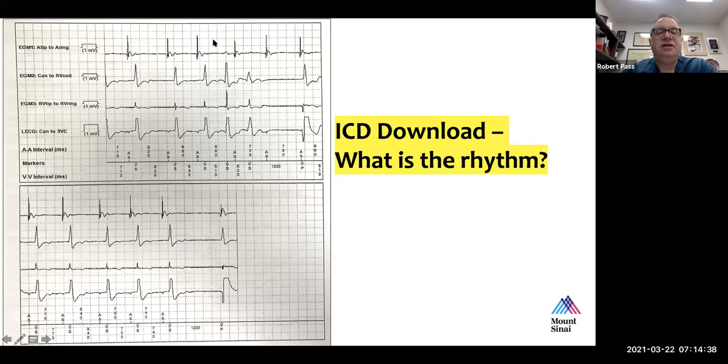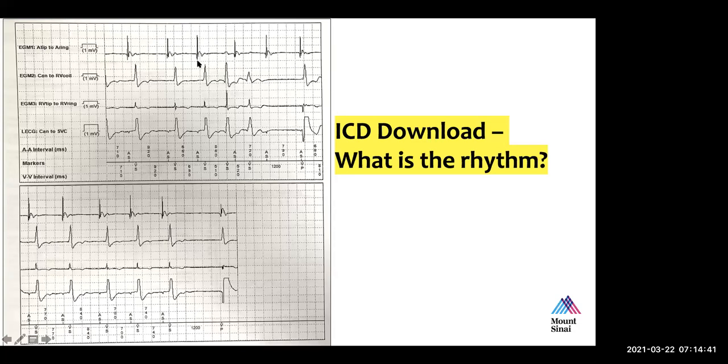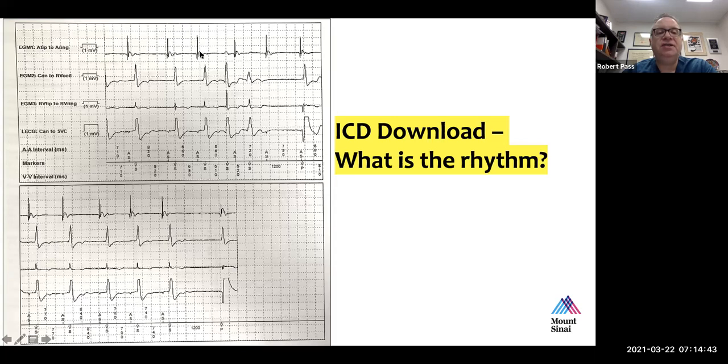Thankfully, however, I think you would agree that the atrial electrogram is far greater in size than the ventricular electrogram. In this particular case, the atrial electrogram is quite gigantic for an atrial electrogram. It's about 10 millivolts. And so it would be very easy to program this device so that it would see the atrial electrogram, but ignore any small far field ventricular electrogram.